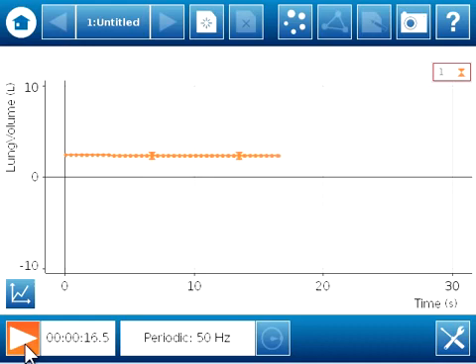So when it says ready, I can pick up the spirometer and I can hold the tapered end of the mouthpiece in my mouth, kind of holding it between my teeth and letting my lips form a seal around the spirometer. And I'm going to just take normal breaths, making sure I breathe only through my mouth and not through my nose.